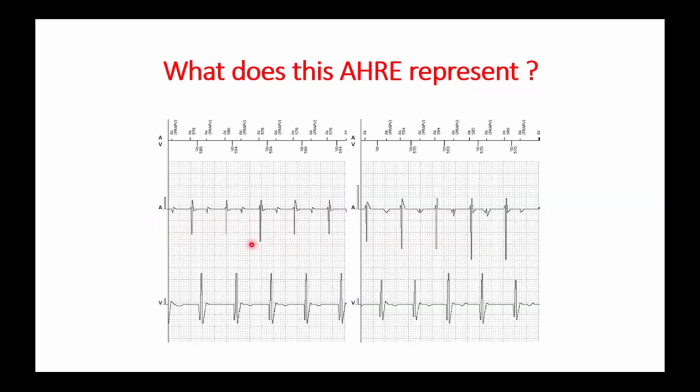Answer, Ahmed. Okay. Here we can notice the atrial EGM shows two different deflections. One is sharp and precedes the V, and the other is almost simultaneous with the V. And the interval between them is not fixed.